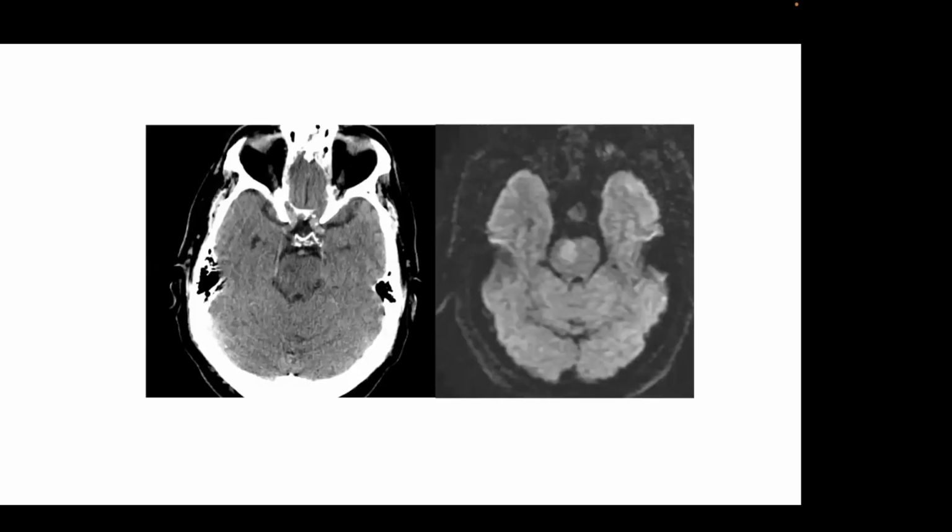So again, that's what the CT looks like, and we've seen it a few times. This is what the MR scan looks like to match that. So this is the diffusion weighted scan. The conspicuity on MR is much, much greater than on the CT. And I'll show this to you side by side. This is actually another patient, but it's just showing you what a pontine infarct looks like on the CT, and this is what it looks like on the MR scan.